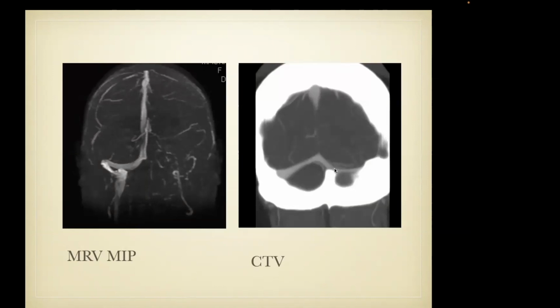You can see the left transverse sinus in this location is open, but it's small. Now, why is it not visible on the MR venogram? Well, there's two reasons. One is resolution is not great. The second reason is that the flow tends to be low, and we also have these properties of in-plane imaging.